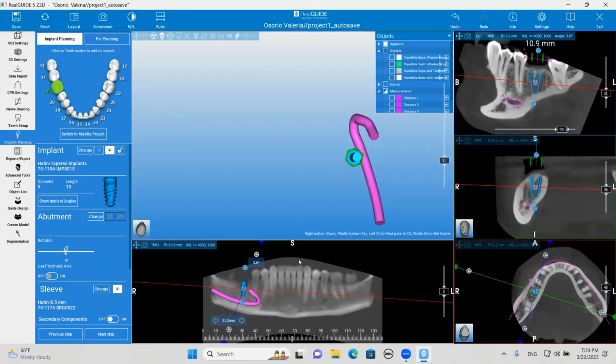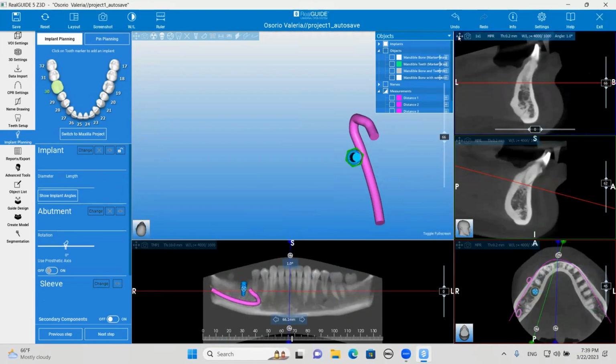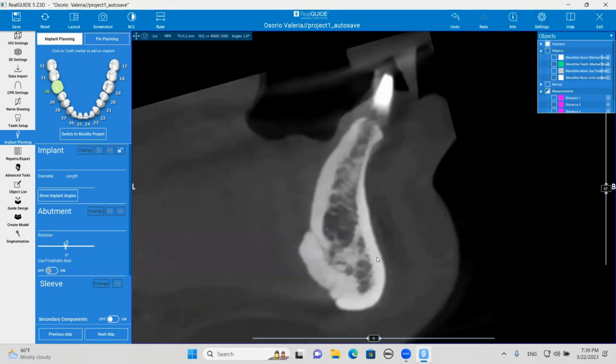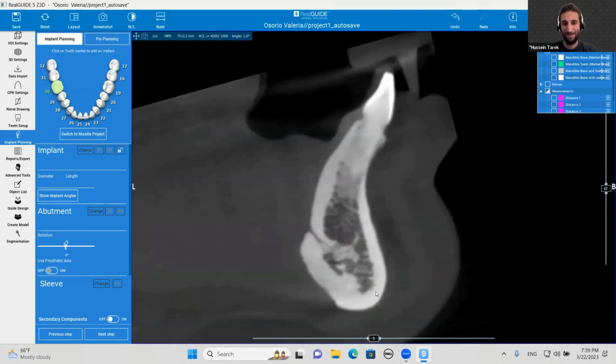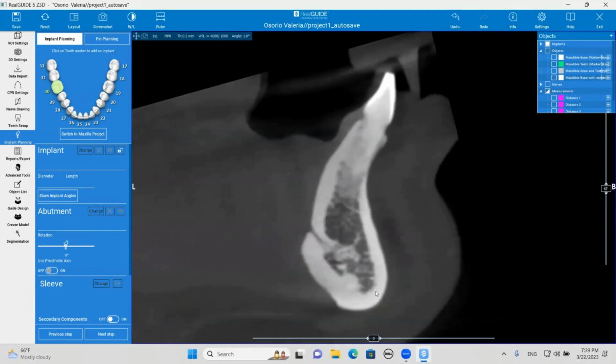Great. What was that, Hussein? You said you had some. We had a very interesting anatomy at the anterior mandible, Dr. Resnik. Oh, okay. Here you go, sir. Scroll through. Okay. Oh, go back. Hold it right there. Go back, one more. Keep going. One more click right there. Hold it. Nope. Go back. Here we go, sir. Okay, show them the opening there. So this is at the midline. Yes, sir, we're exactly at the midline.